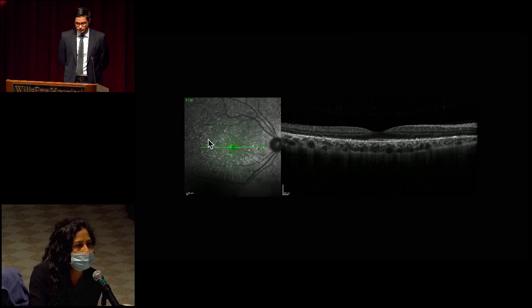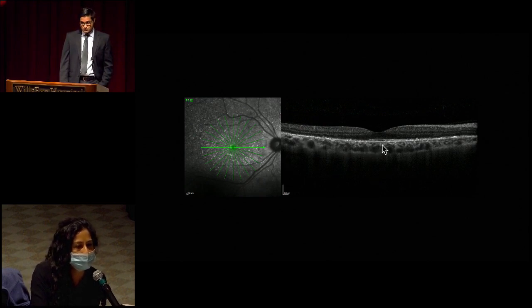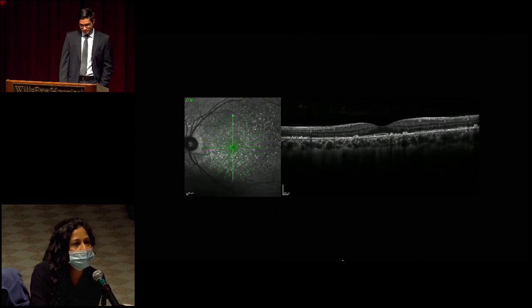This infrared image highlights nicely these hyperreflective spots throughout the macula. Going over to the B scan itself, the vitreous is clear, intraretinal layers look well preserved, choroid looks normal, but we see a pretty significant loss of the outer retinal layers, ellipsoid zone and IS/OS junction, although it is well preserved in the fovea, which explains the good vision of 20/25. Then we see areas of clumping. I don't know if this is pigment clumping or migration. Similar findings in the vertical cut. We do see more prominent, what looks like pigment clumping here.